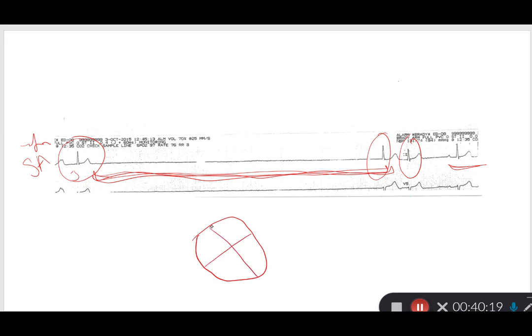So what happens with this patient? She ended up getting a pacemaker implanted, so she doesn't have any sinus arrest again. But for whatever reason, and usually we don't know the reasons, she had a heart condition, that she's firing at her SA node, and all of a sudden the SA node is like, oh, I quit, I'm stopping, I'm going to take my union break.